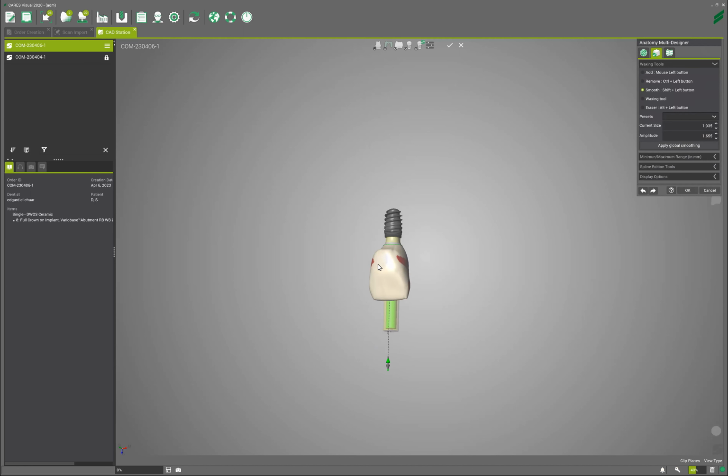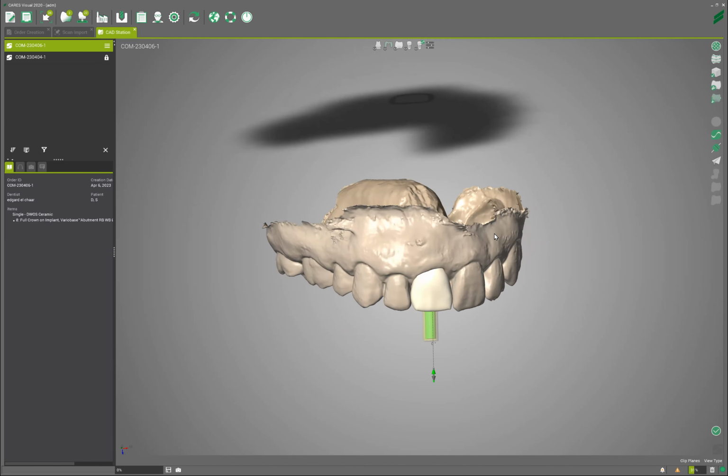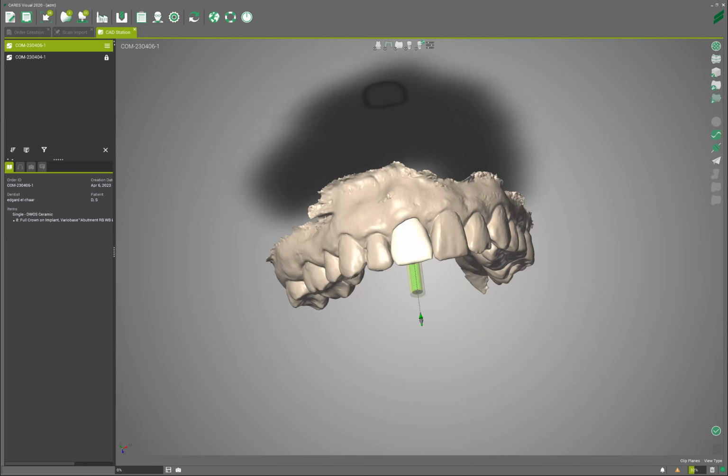Yeah, there you go. And now I'm gonna go back to co-diagnostic and see how it looks on the co-diagnostic. And before that, I'm going to bring it back to here. And I think it's a decent outcome. But the most important is to go back to co-diagnostic.